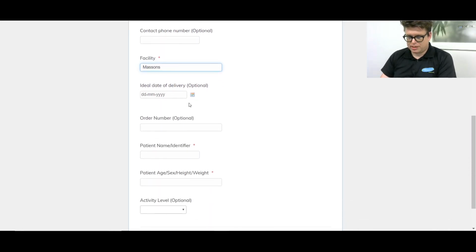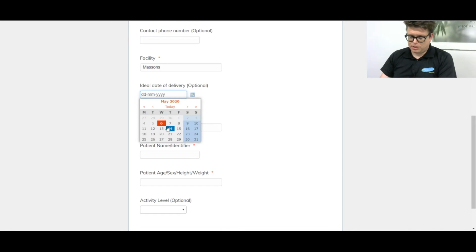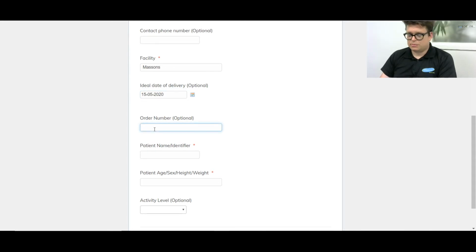We have an ideal delivery date option as well. We charge extra for rush jobs, but generally our lead time is 10 business days. For foam carvings, it's overnight, but we do a same-day service on that as well. For this one, we'll just go 10 days. Order number, if you use them, put it in. It'll help us identify it if it comes in separately from this form. Another important one is the patient identifier, particularly if you've got multiple jobs with us. It allows us to obviously contact you and identify which patient we're talking about. So we'll just go test.